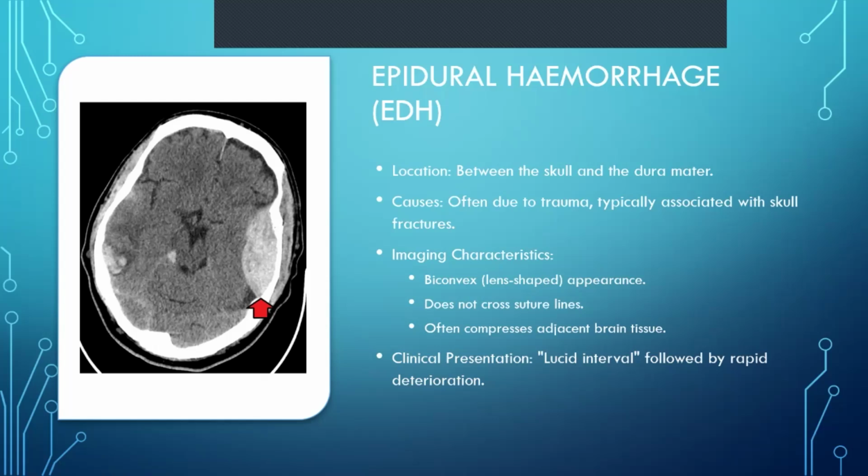So epidural hemorrhages generally occur outside of the dura. The dura itself is a limiting factor to the spread of the bleed. However, it can't contain bleeds. But with epidural hemorrhages, you'll find that it takes them a much longer time to actually become extremely large, but they can become extremely large. So don't be fooled. But the best way to remember it is to think about a bleed that starts off in one place and then is slowly pushing its way out so that it gives you this concave shape, or convex shape, depending on which way you look at it, all right?